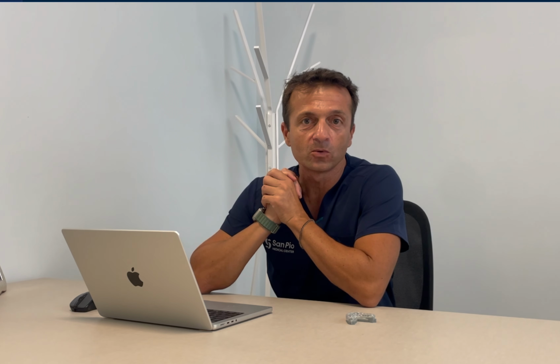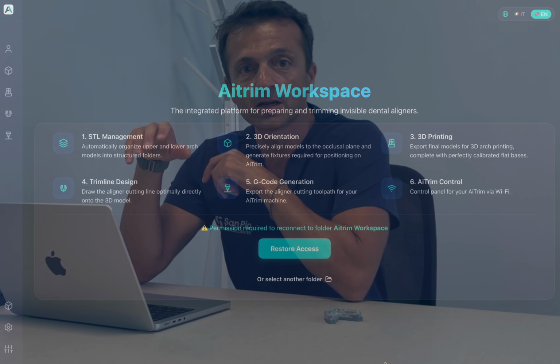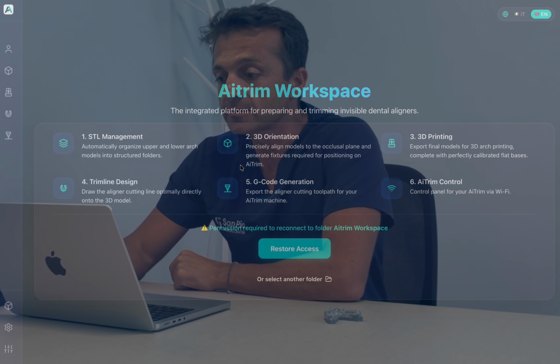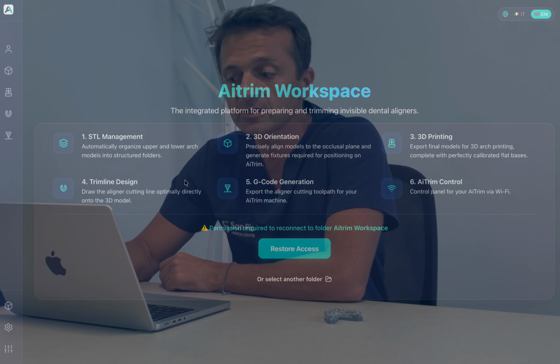Everyone! Today I want to show you how our workspace works. So let's start from the main screen. When you open our interface, you have this main screen and you have all the options that you can use in our workspace.